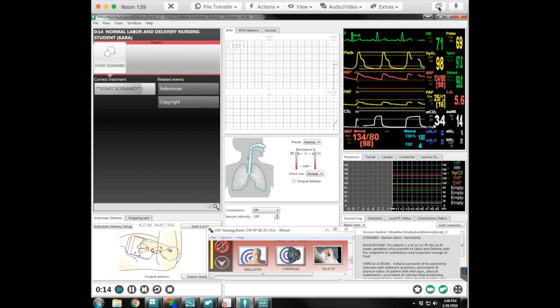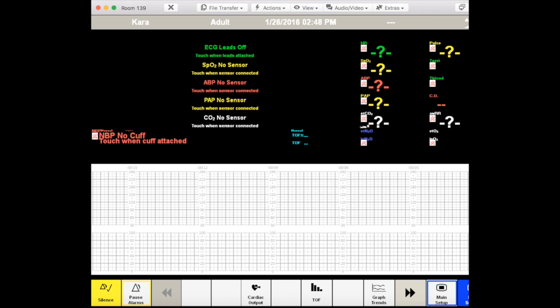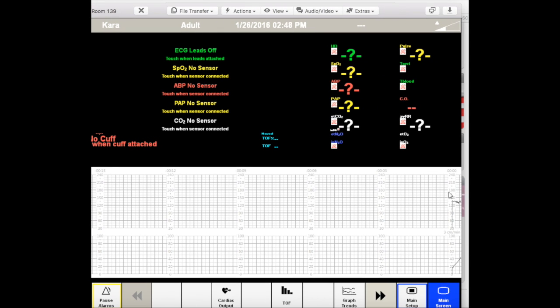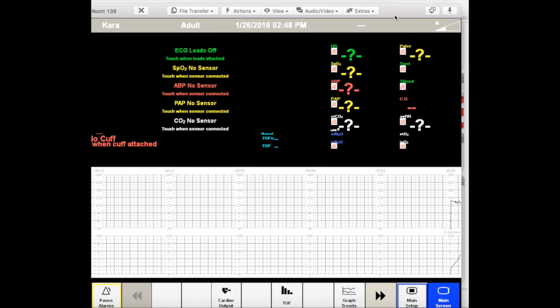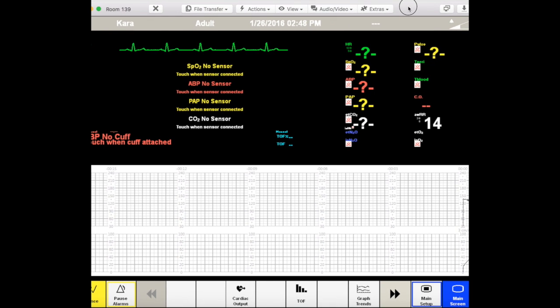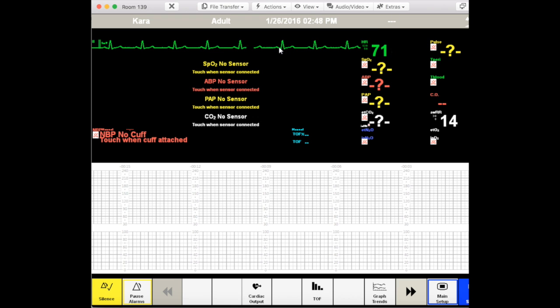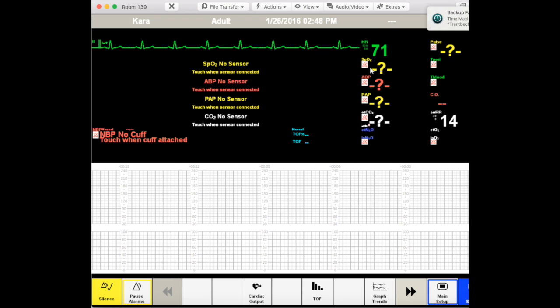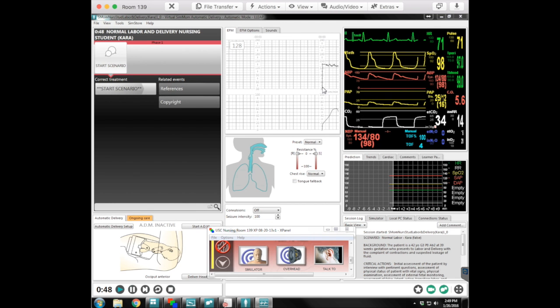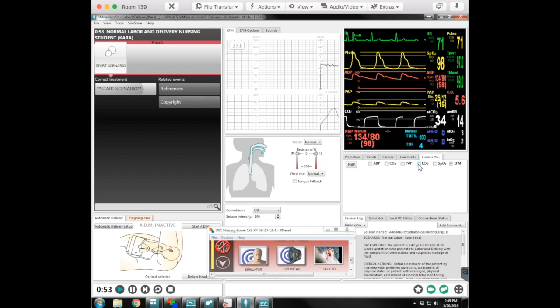If I pop over to the patient monitor, you can start to see what's coming into view right over here. Let me just move this over a little bit. You can see fetal heart rate. You can hear it. Students can physically tap the screen to get that to work with their finger, or you can do it yourself with the software. All right. Go back to my other monitor. I'm going to turn that off, as far as the ECG, because that's a little annoying.